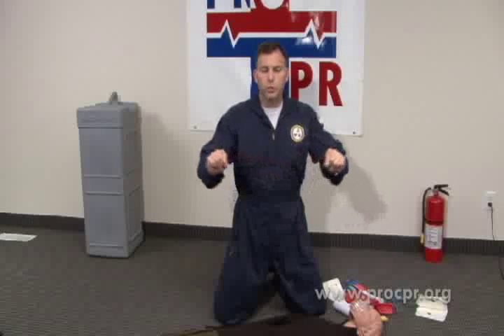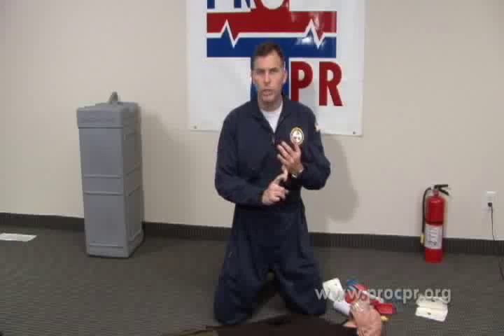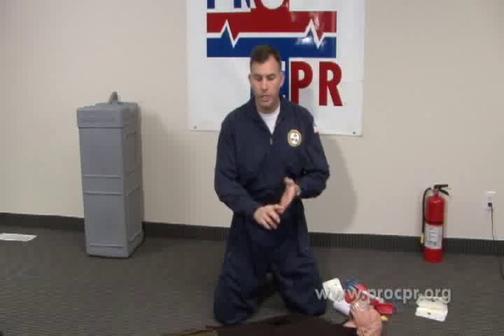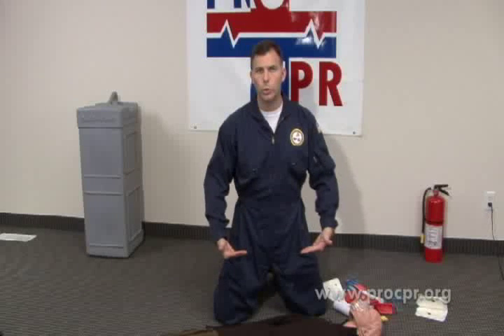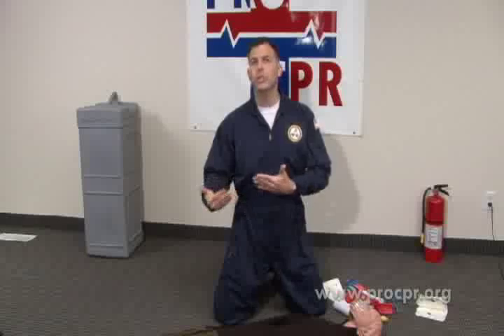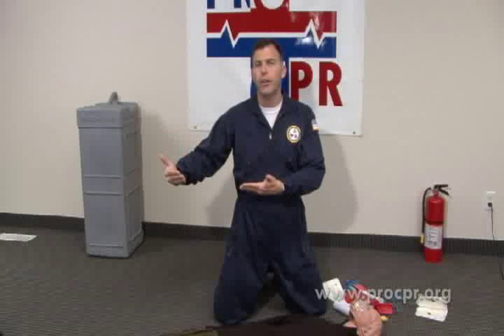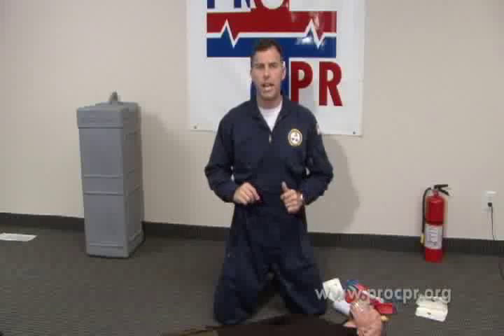There are a couple things we're going to mention about setting up the scene and making sure the scene is safe. We want to make sure that there are no combustible liquids, no combustible gases, no standing water, no water under the patient or around the patient or touching the rescuer. Those would all be contraindications to using the AED until we could move the victim to another area, which would then be an actual safe area to be able to apply the AED protocol.